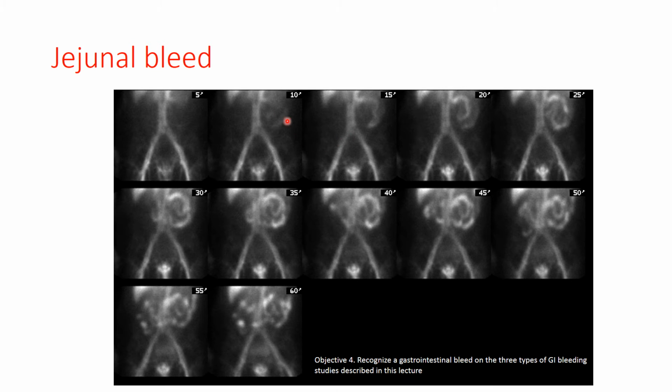On this patient, by the 10-minute interval, or at least by 15 minutes, but probably by the 10-minute interval, I would have already called the angiographer and said, okay, this guy's positive. Whenever you're ready, come over and take a look, and then you can take the patient whenever you need to. But you see, even at the 60-minute interval, this is throughout pretty much all of the jejunum, maybe starting to get into the ileum.